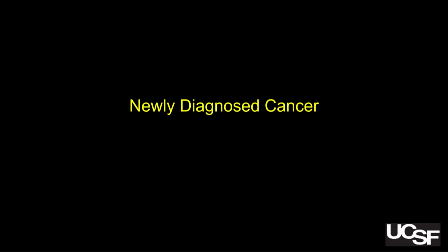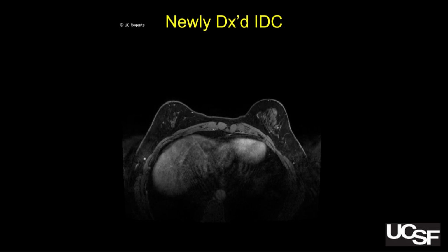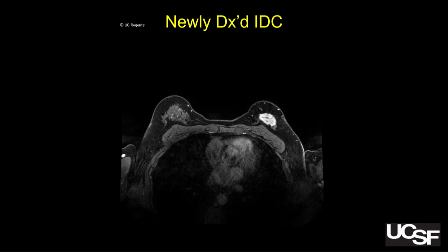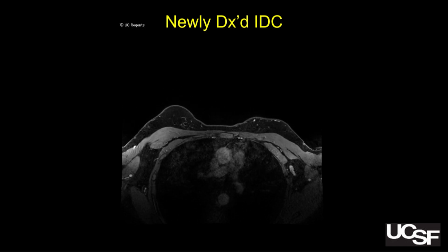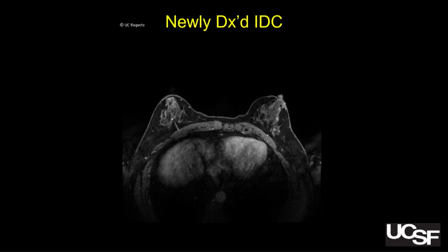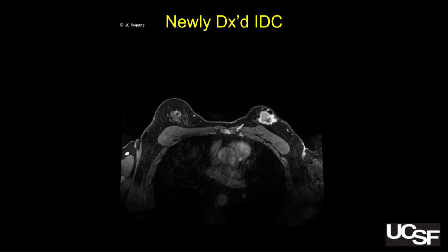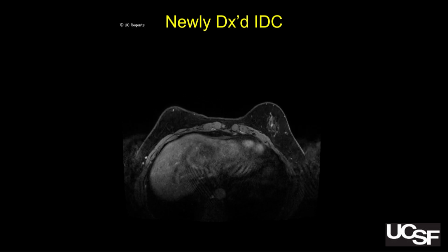Case 2, newly diagnosed cancer. You get the whole stack, give you time to digest. Ooh, yes. Okay. It's going to go again one more time. These are actually the hardest to read, I think. These take the longest. Give me a normal screener anytime, but then the newly diagnosed cancer, that's the one that kind of sits on that list. You're waiting like, okay, will the colleague take it first? Who's up next?